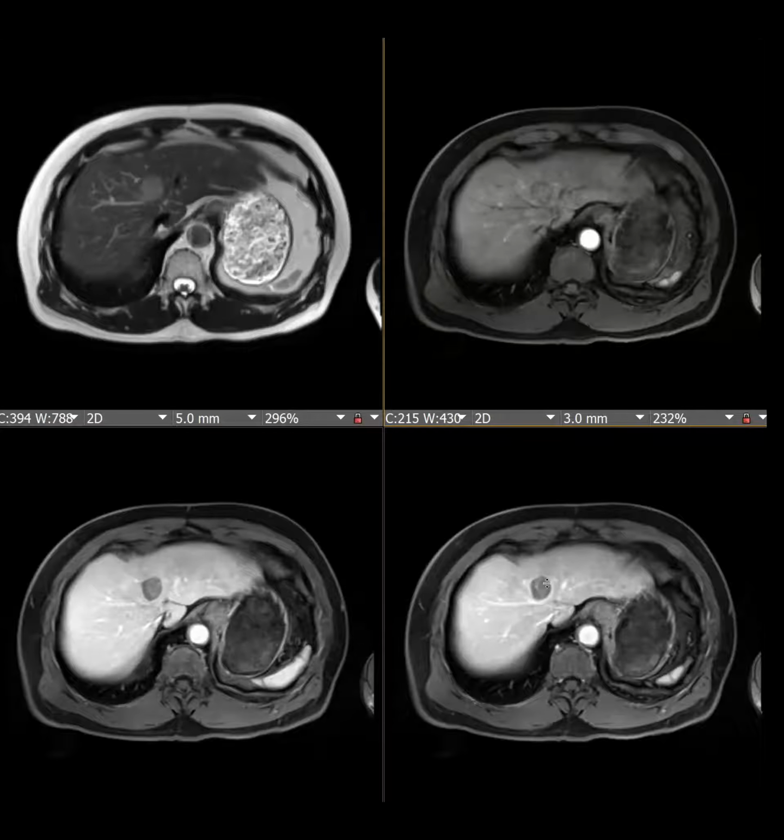Any underlying liver disease? So that's the perfect question. The patient has hepatitis B. If the patient didn't have liver disease, the liver itself doesn't look grossly cirrhotic, but Dr. Chernyak correctly identified that this patient has hepatitis B, and based on that information, this would be a LI-RADS 5 lesion, and that is absolutely correct. So that was my case to share with the group.